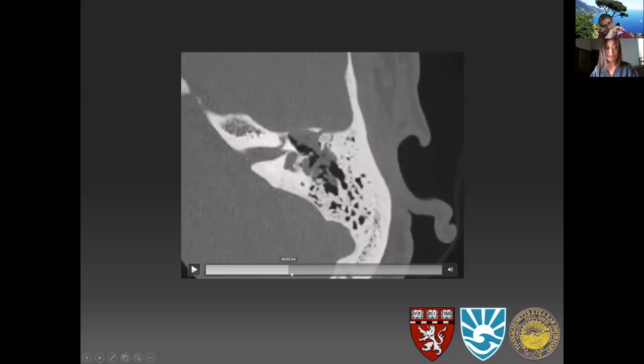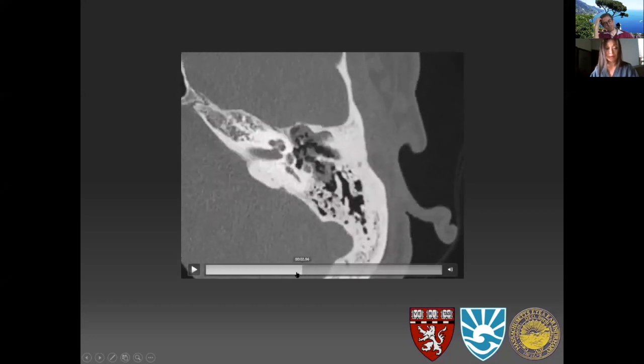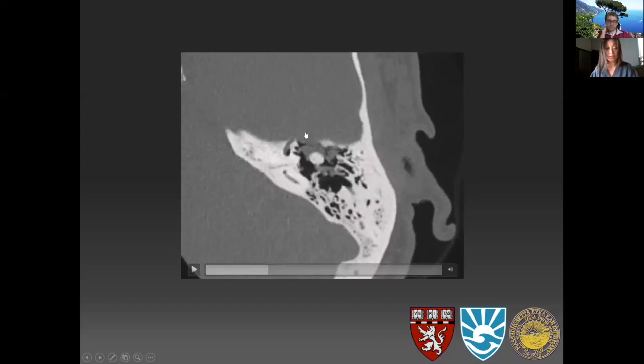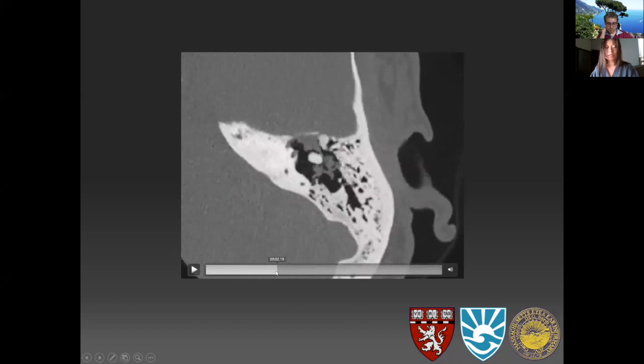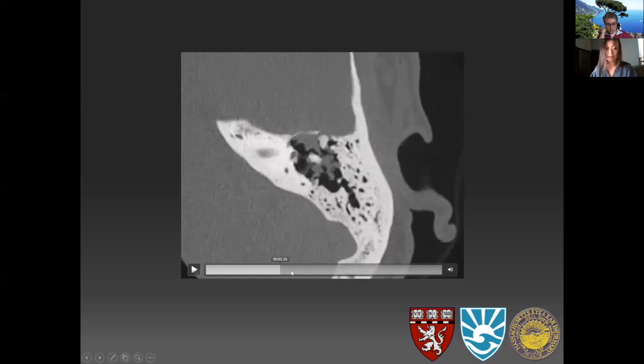The tympanic facial nerve over here is inseparable from the middle ear opacities. In the superior semicircular canal, as you follow it up, there is now gas in it. So this erosion or destruction is going all the way into the membranous labyrinth structures and skeletonizing things. It's quite aggressive, this process.